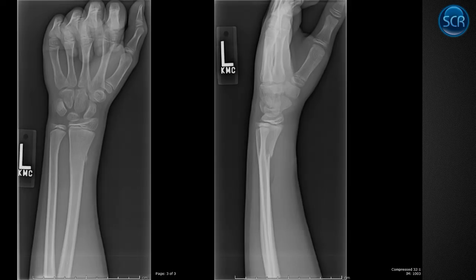It's very common. And so then to compare that, this is a greenstick fracture where it didn't buckle. It actually broke, but it didn't make it all the way through. So we have some intact cortex on the posterior and medial surface or ulnar side, but we do have some actual focal cortical offset here. So this fracture only came partway across. So this is a typical greenstick fracture. It's very similar to the prior case.